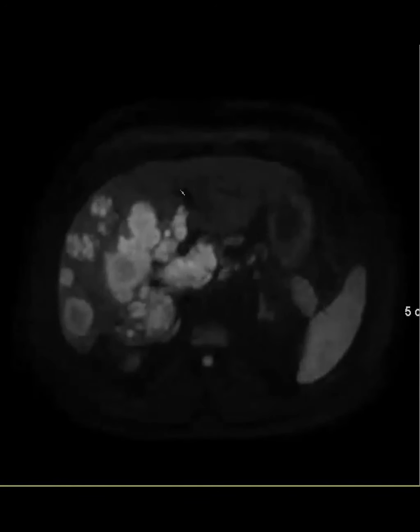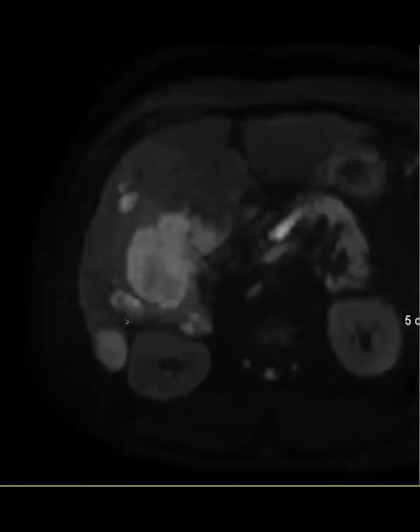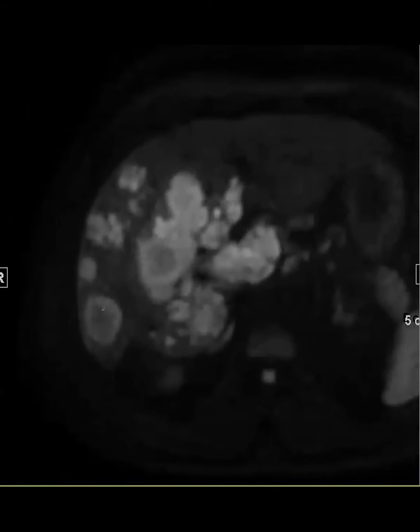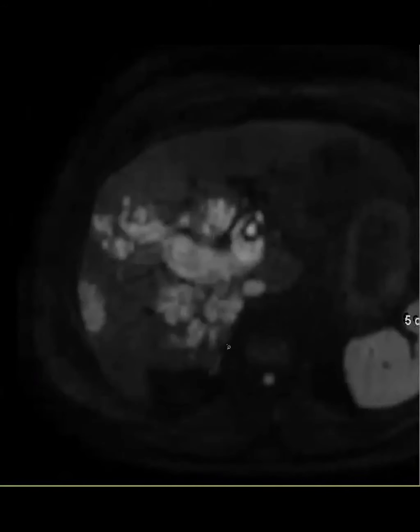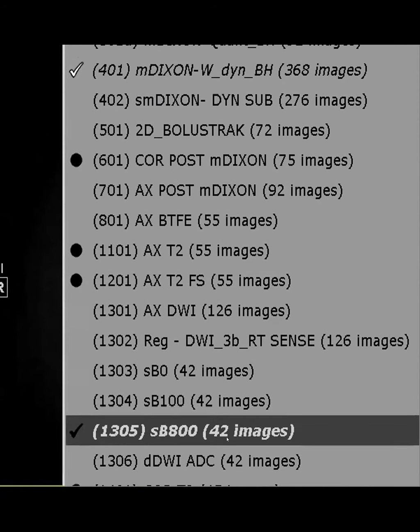Interesting you should say that. If you look at what the tumor looks like right now, a lot of these areas have a targetoid appearance, which is generally a sign of cholangio. But again, what I think happened is the original tumor is just an infiltrative HCC.